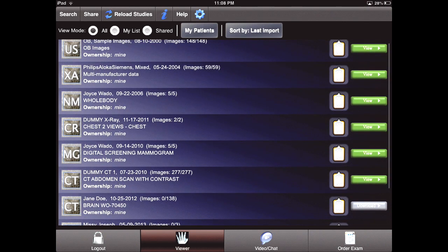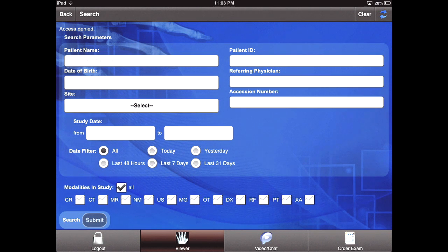Now you can search your DICOM archives. Search over here. You can select whatever archive you have connected. You can connect it to multiple archives and import your studies. Again, we have a proprietary method of importing studies, so we're going to import these fast, very, very fast, extremely fast. Now let's go back.